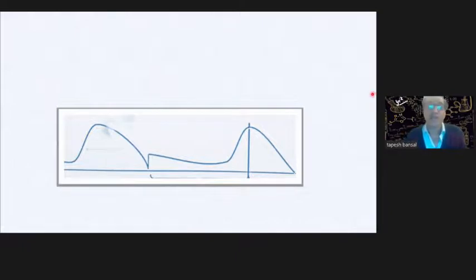This is a volume scalar. That much I'll tell you. This is a volume scalar. So this is actually expiratory valve malfunction.